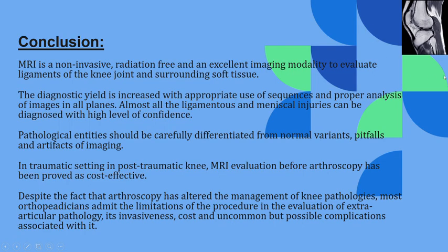Pathological entities should be carefully differentiated from normal variants, pitfalls, and artifacts of imaging. In the post-traumatic knee, MRI evaluation before arthroscopy has been proved as cost-effective. Despite the fact that arthroscopy has altered the management of knee pathologies, most orthopedicians admit the limitations of the procedure in the evaluation of extra-articular pathology.